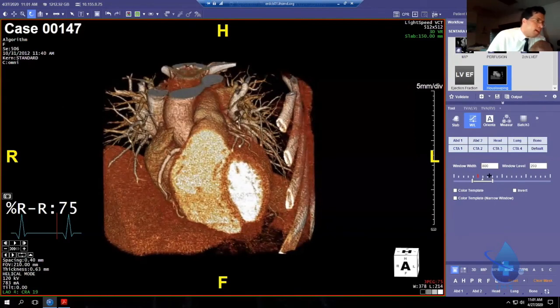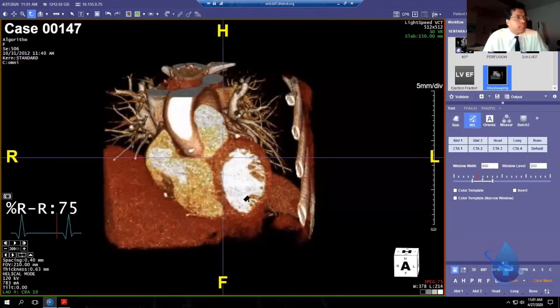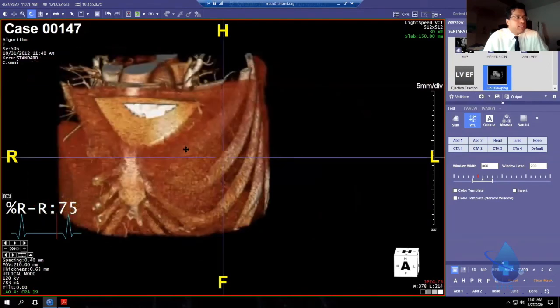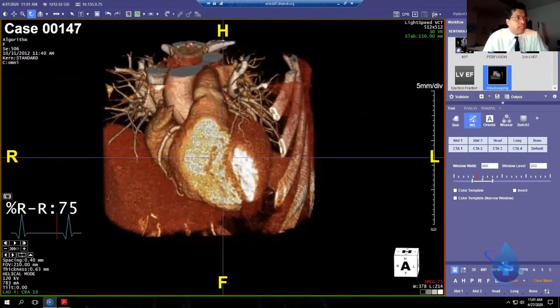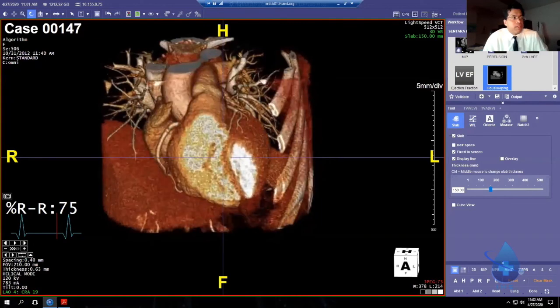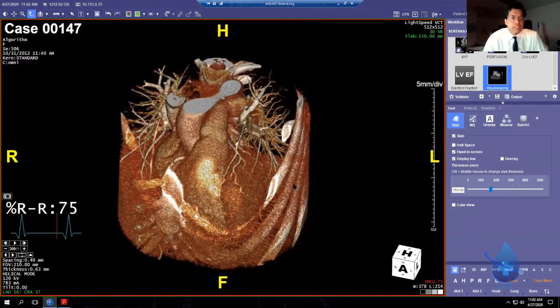Now, other buttons you may need. This slab button. Sometimes I will start to cut in through the data set and it will lock. It will be stuck and I won't be able to cut through the data. That's because I've noticed there's a bug in the software. I have to click this slab button twice and then it will let me cut through. That might come up. It's a bug that's been in the software for 15 years and they still haven't changed that yet.